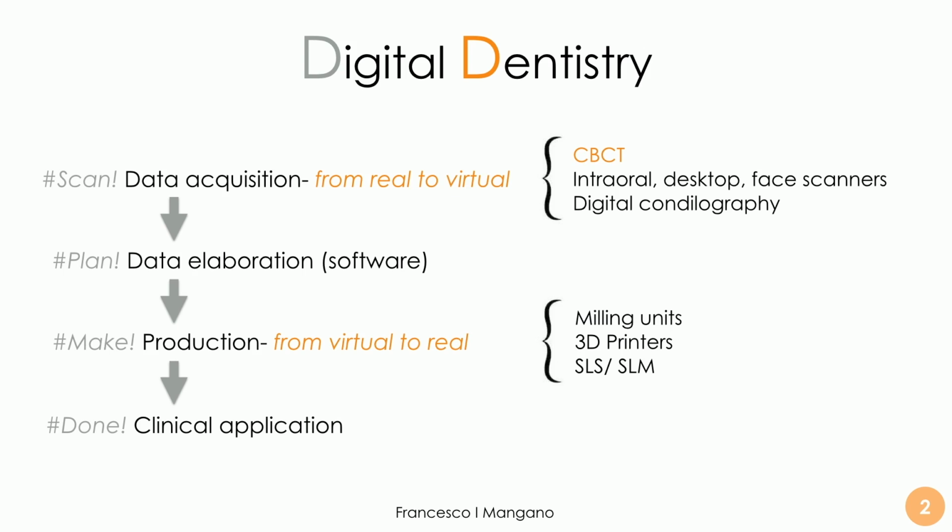We produce our individual hybrid abutment in zirconia by milling, using a powerful 5-axis milling unit. We use the same units for the fabrication of the final crowns, usually monolithic zirconia crowns, in some cases monolithic translucent zirconia bridges. In some cases with very high aesthetic demand, we can instead use copings or frames in zirconia that can be veneered by the dental technician on a model.